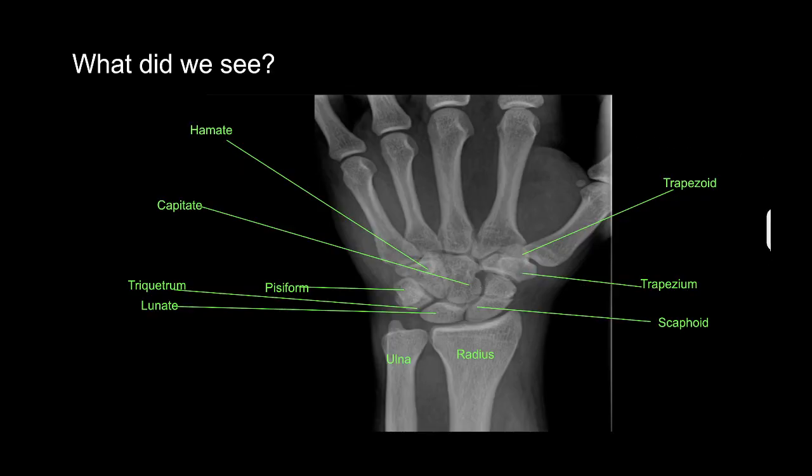So I know that's a lot. That's a lot of different carpal bones on the wrist to think about. And we'll get into a way to make it easier. But just looking at that, similarly to radiographs we've talked about before, take a moment to think, what's wrong with these bones? What looks a bit different?